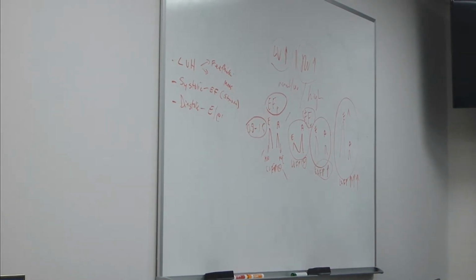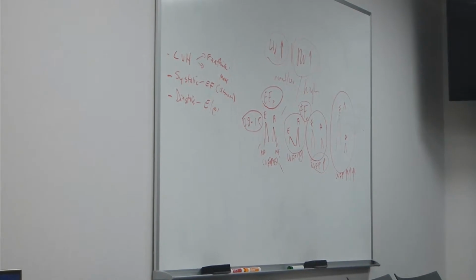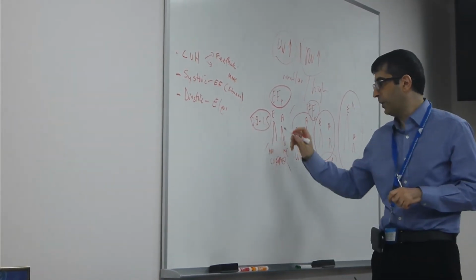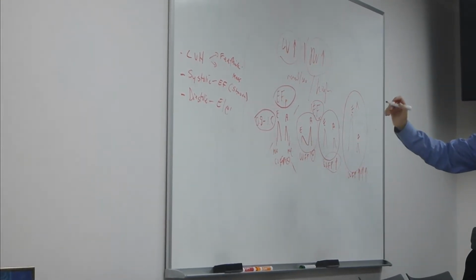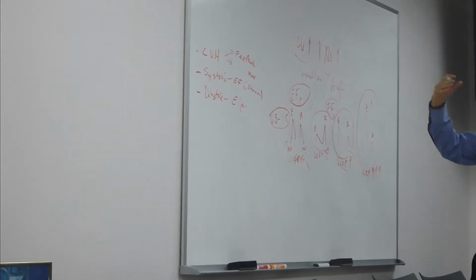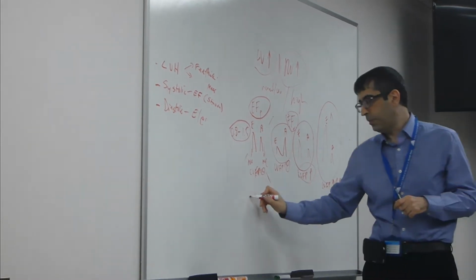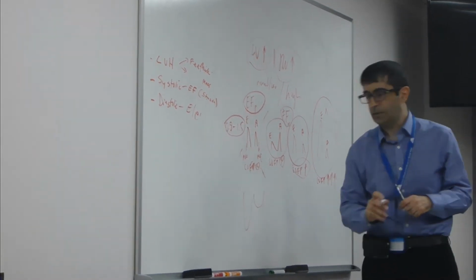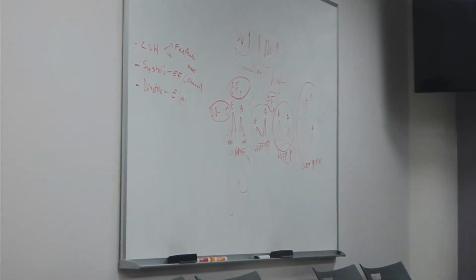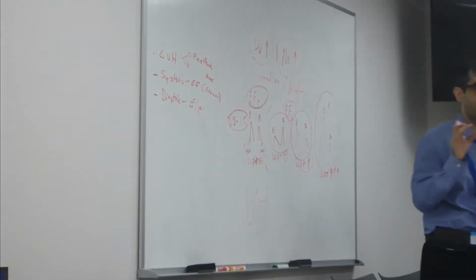So what happens usually, normal tissue Doppler. Do you understand the concept of tissue Doppler, more or less? When you do the inflow, it essentially tells you how the blood flows from the left atrium to the left ventricle. It's essentially the velocity of flow, right? With the tissue Doppler, it's like the mirror image of your inflow, but instead of sampling the blood flow, we're sampling the tissue.